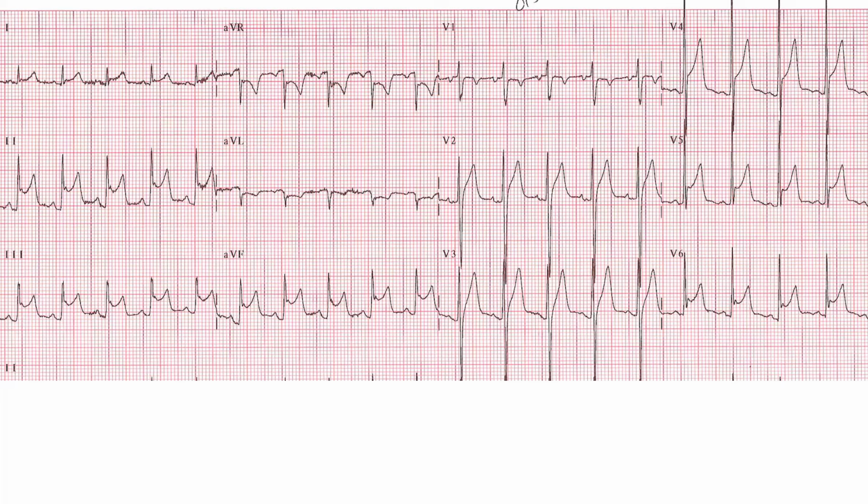You do not have T wave abnormality, whether large T or inverted T, and you do not have reciprocal ST depression, except for the ST depression that is expected in pericarditis, in aVR and a little bit in V1, the leads that look away from the axis of the heart, the axis of the diffuse ST elevation. So this patient has acute pericarditis.